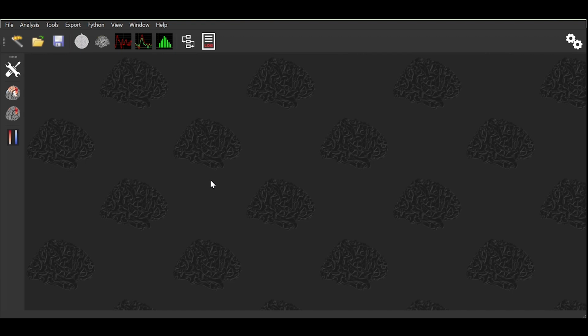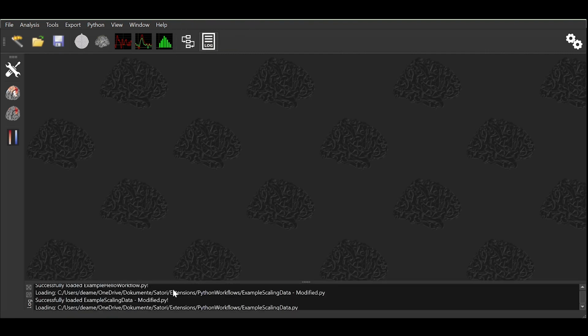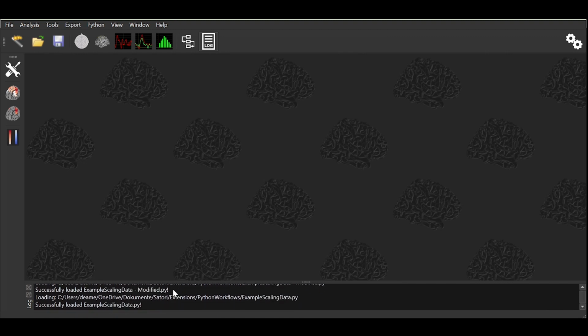Let's open the log view by clicking the red flashing log icon here. There is so much information contained here we can't cover it all in this video, but keep an eye on this as you go through your analysis work, as it may answer some questions.